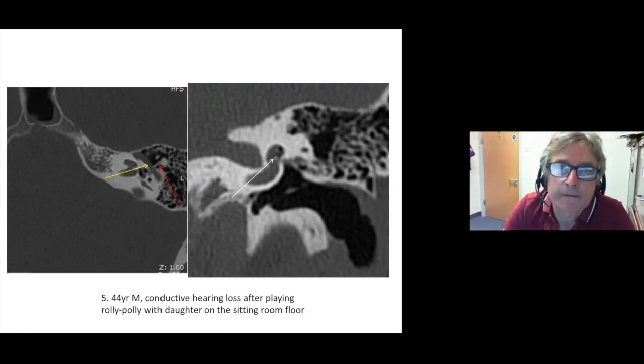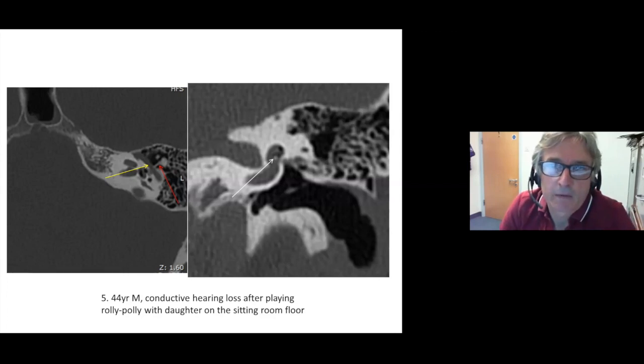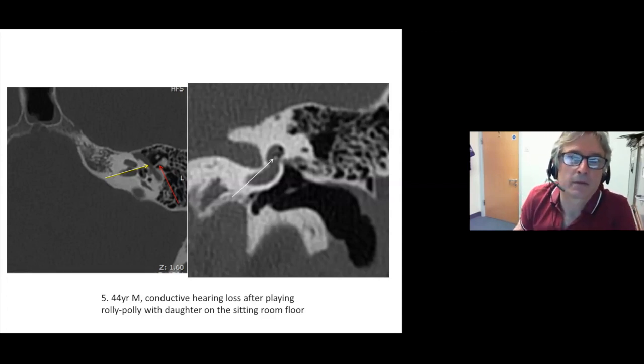What would we call this? And how did he do it? I'd have to say the white arrow is quite tricky. So you get an extra 50 points if you get that one right.